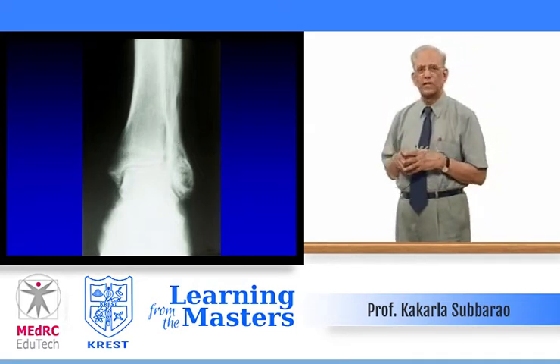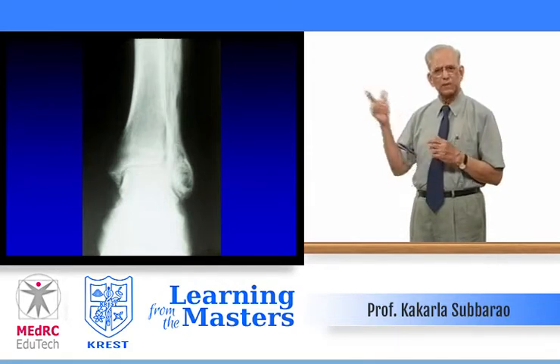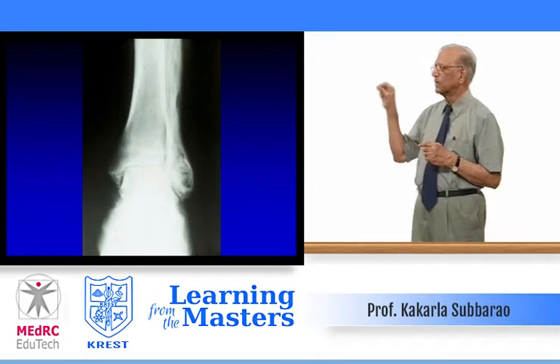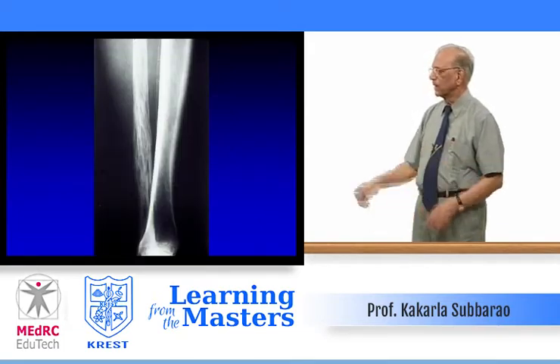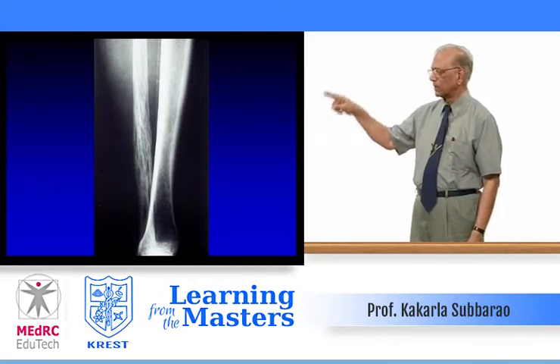Many of the textbooks say that fibula is almost never involved, but there is an exception to the rule. The lower end of the fibula is involved, it's bigger, brighter, and the process goes all the way to the tip of the lateral malleolus. Again, in the lateral view, you could see the bizarre trabecular pattern of the fibula.